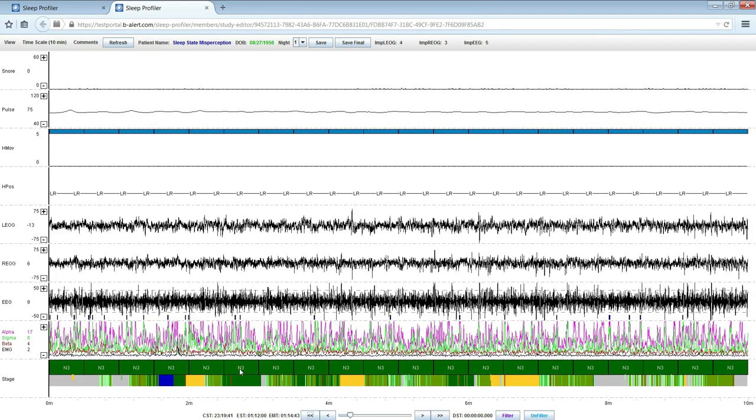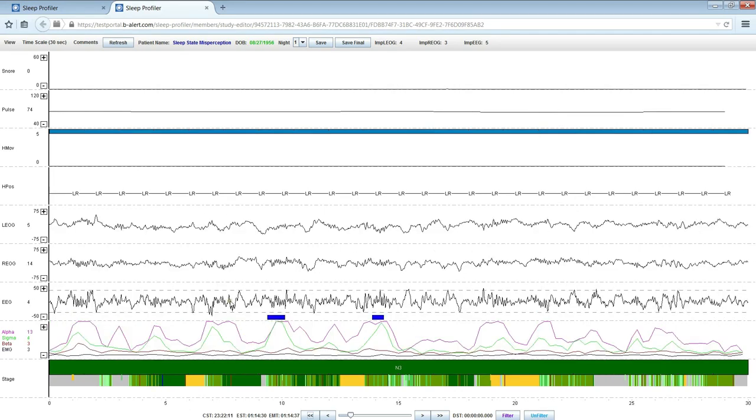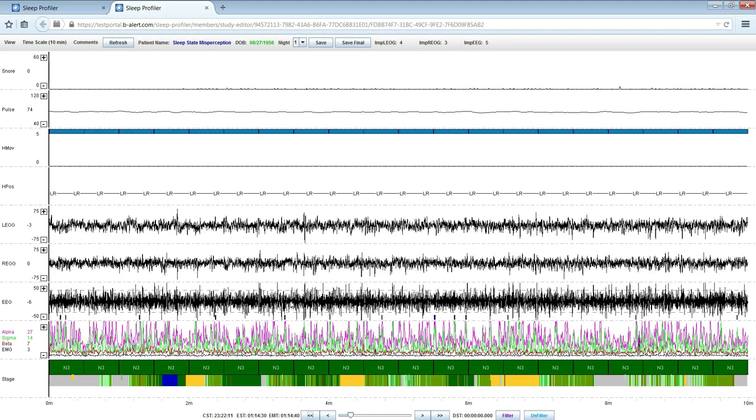And now they're in slow wave sleep, and I'm going to check by left double clicking and confirm that the amplitude is within the plus or minus 30 microvolt range in a sufficient portion of the epoch to confirm that it was properly staged. It is, so I'm going to press page down, and rather than check all of these epochs, I'm going to assume that the auto staging will be scoring them all consistently.